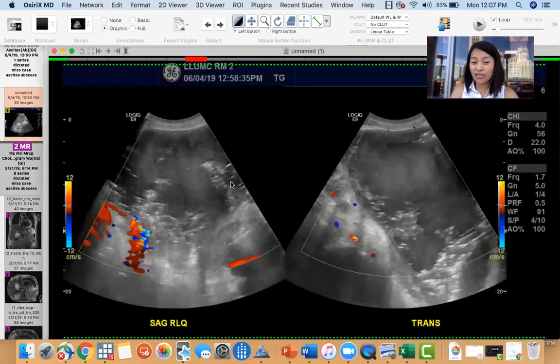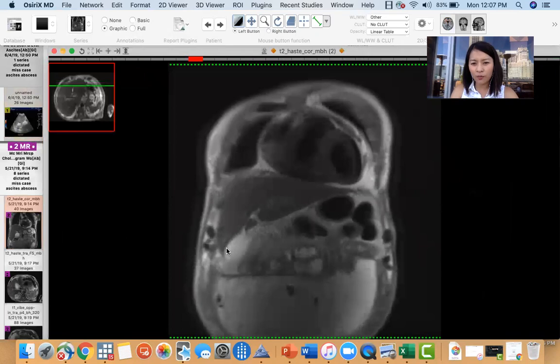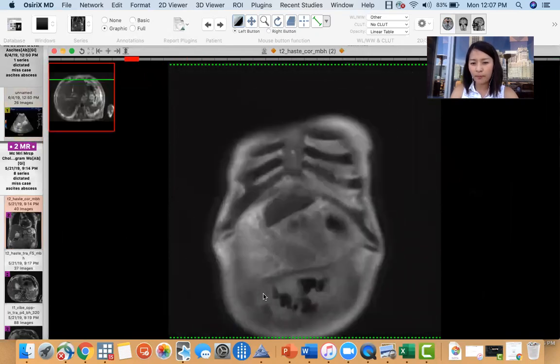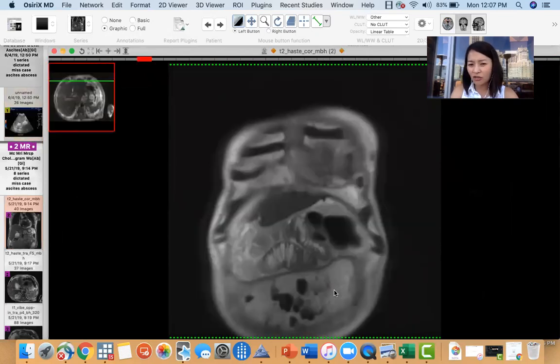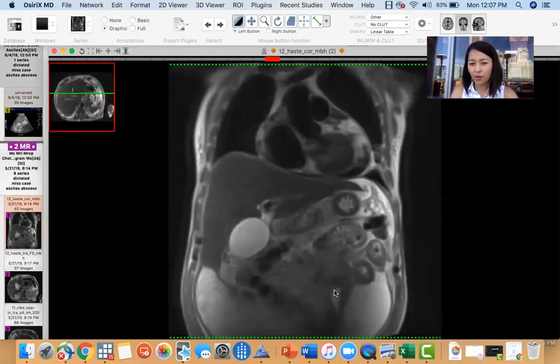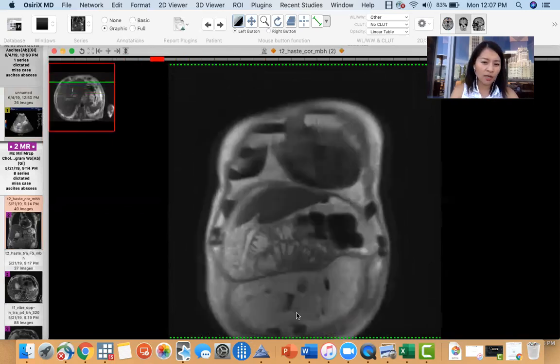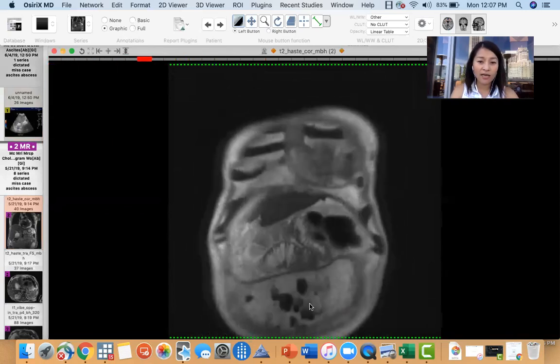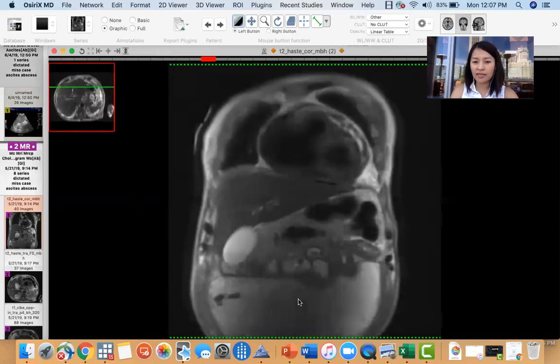There was no prior CT, so the initial presentation was on MRI, and so just be careful, because if the ascites looks complicated, you want to look for other things. This patient didn't have contrast enhancement; it was without only, so it would have been very hard to tell. But if you're careful, you can pick up these other findings of infected ascites. So you have air bubbles here, complex loculations, and also restricted diffusion.